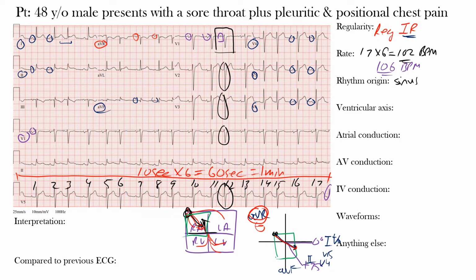Here's a sinus P wave, and then the one that follows has a different morphology, okay, and then we go back to our sinus P wave, and then one that has a different morphology, but these both have the same ones, okay, and we said they're also coming sooner than expected, so they're premature beats, okay. So we have the sinus origin for most of the beats, and then we also have another beat that's likely coming from somewhere in the atria or as a junctional beat. So we're just going to simply call these premature supraventricular complexes, or you can call them beats, okay?